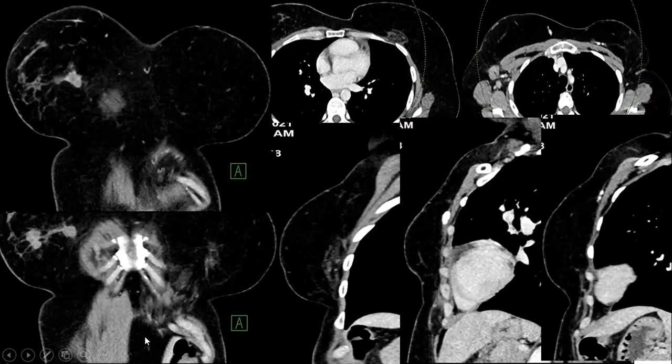The muscle is reflected from the abdomen into the left breast, making the reconstruction of the breast. This is the muscle here. That is why it's atrophic, containing fat. This is a flap. What you have seen on mammography is a muscle flap, and the CT helps show us that the muscle flap is not latissimus dorsi, but rectus abdominis muscle.